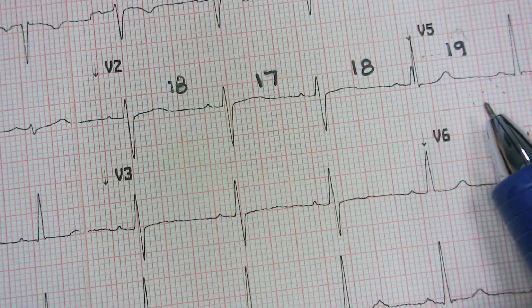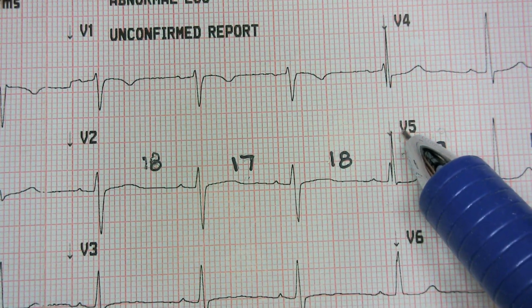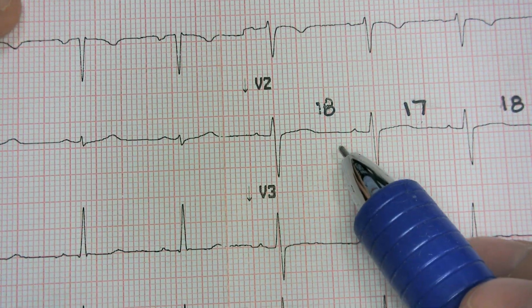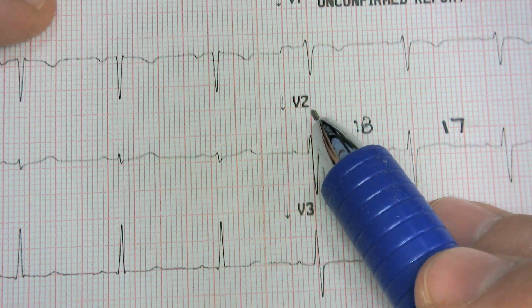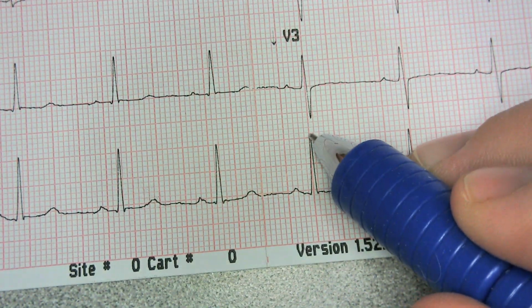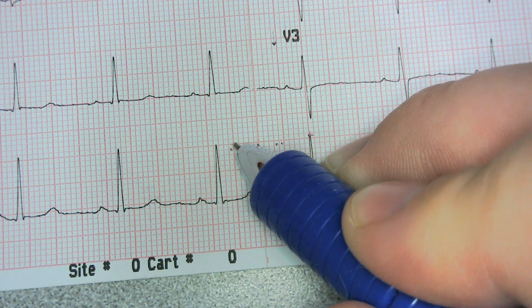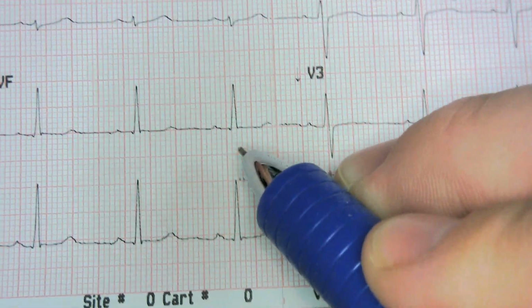So far, pretty good. What I like to do when I'm not quite sure what to do is this: this is where your rhythm lead comes into play, because it's going to be the same song and dance all the way through. If we follow this down, this is the exact same heartbeat, we're just looking at it through different angles. So 0, we haven't gotten anywhere. 5, 10, 15. It looks like 15 over here, 16, 17, 18. 18 right here.